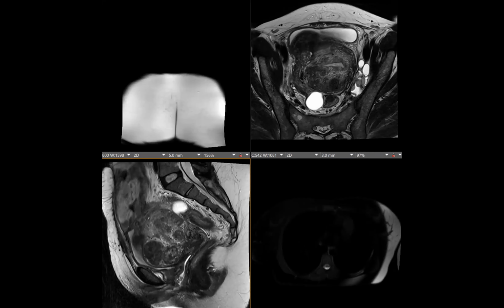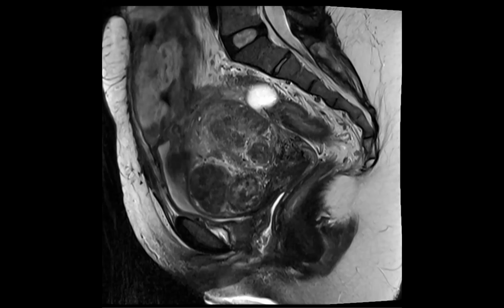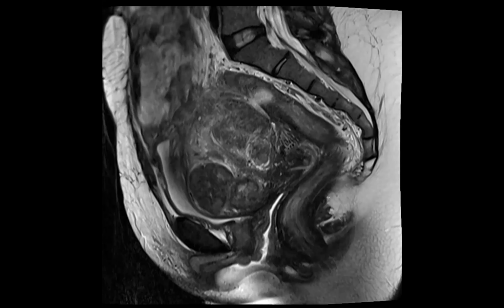Okay, this is a patient with history of endometriosis and prior XLAP, and had a complex history of like TOA, status post drainage, stuff like that, and had a MR. So what do you think?